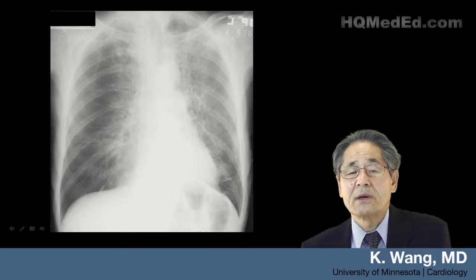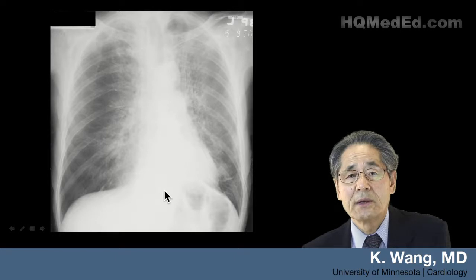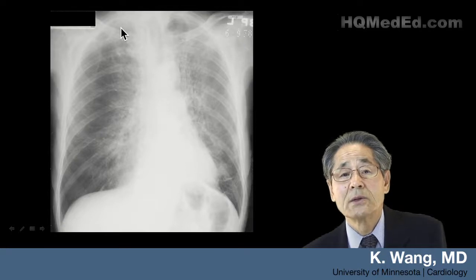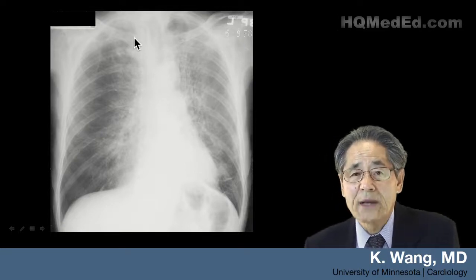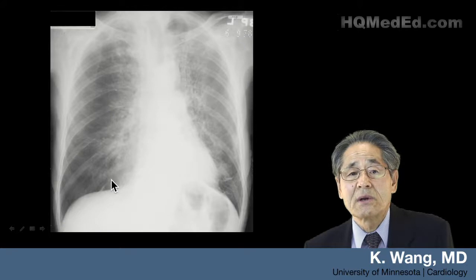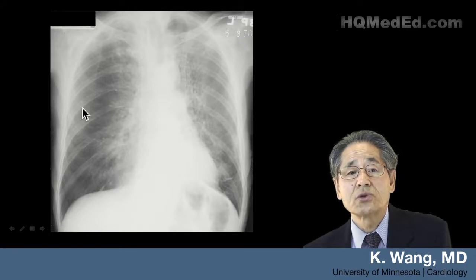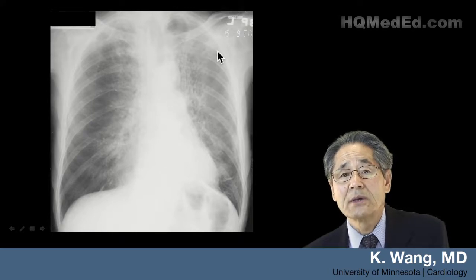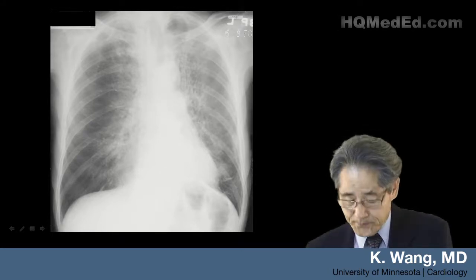Well, this patient underwent radiation treatment. So this outer area is a shielded area, and the radiation is targeted at this area. So radiation-induced pneumonitis, you can make the diagnosis from this almost imaginary vertical line, not spreading to the tissue outside, affecting the tissue only inside, both here as well as here.